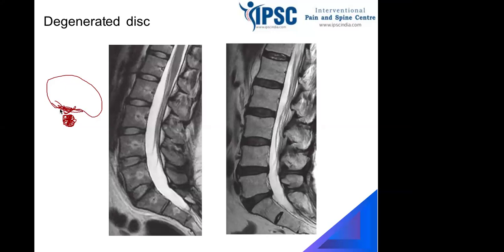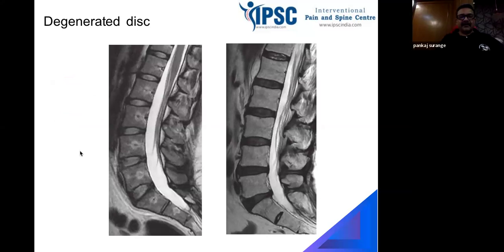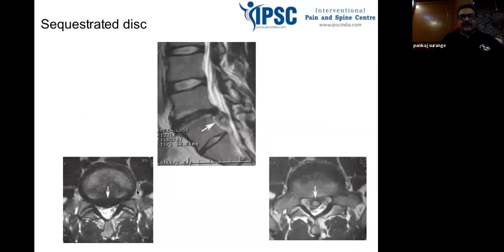When you take a section, I just showed you the example, right? If we take a section, guys, are you okay if we continue? Yes, sir. Look at this.